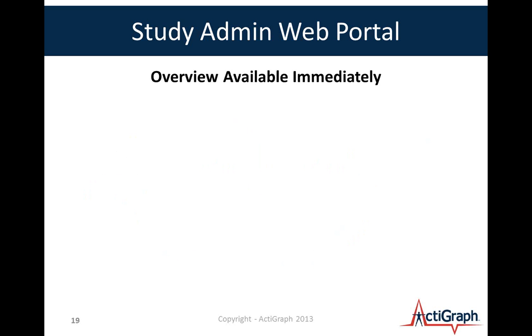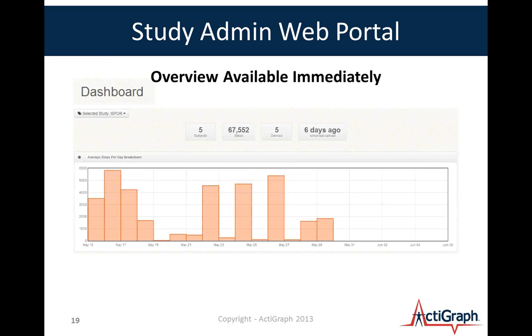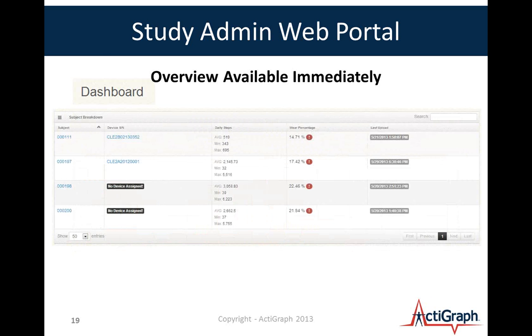And this slide sort of goes into that a little bit. The overview of the data is available immediately, and here's a screenshot of a dashboard for a sample study looking at steps per day. So as soon as that data is pushed to our server and processed, you're able to then see it on the main dashboard view.